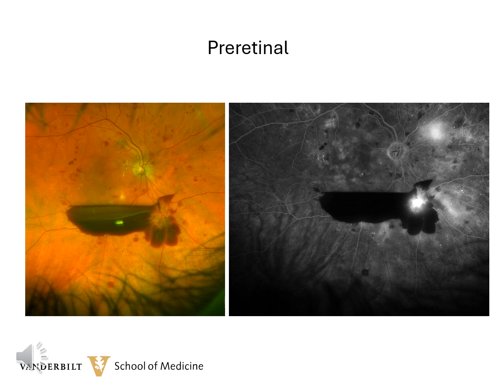The posterior hyaloid gives a shiny reflex overlying the hemorrhage on this particular patient. The angiogram shows some abnormal hyperfluorescence from neovascularization at the nasal edge of the pre-retinal hemorrhage, but the fluorescein from the retinal vessels in the inner retina are blocked by this hemorrhage.